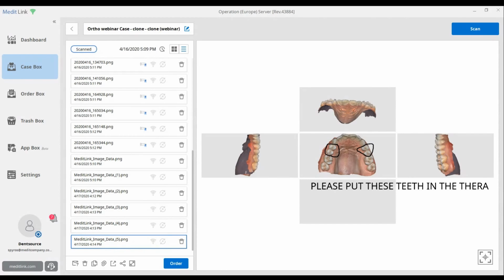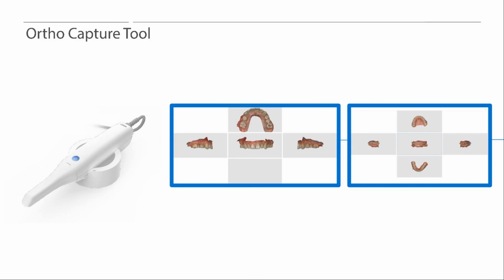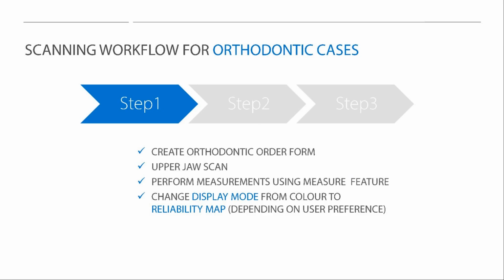So let's go back again to our presentation, and let me share again my presentation. So, okay, now here, as I showed you, is the Ortho Capture tool. And now let's talk about what is the scanning workflow that you're going to use. The scanning workflow is extremely simple. It can't go simpler than that, believe me.